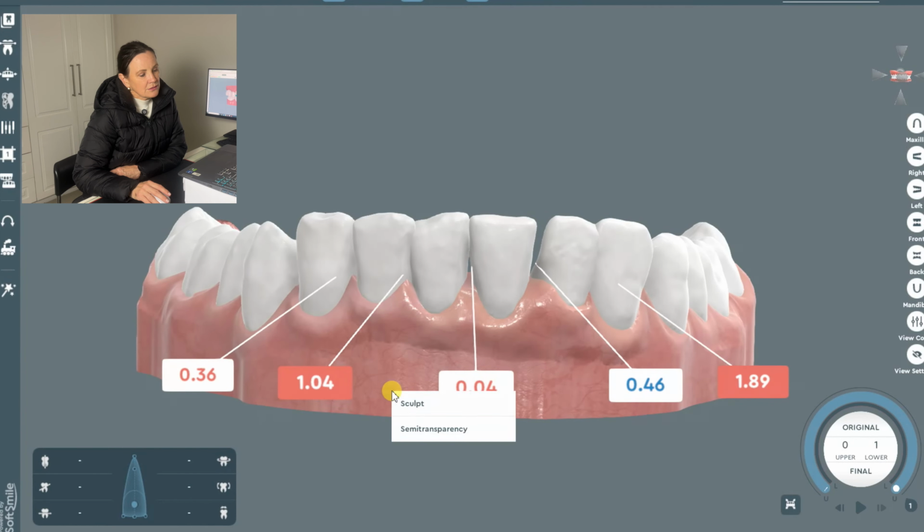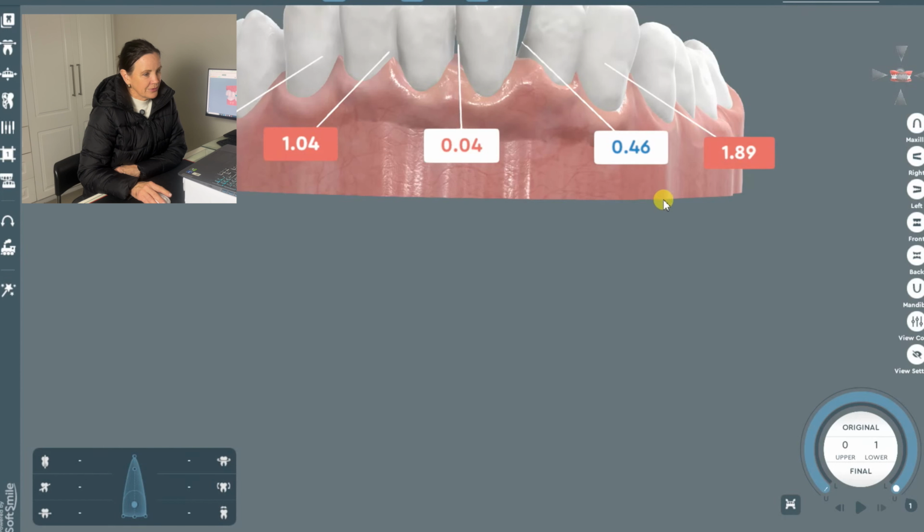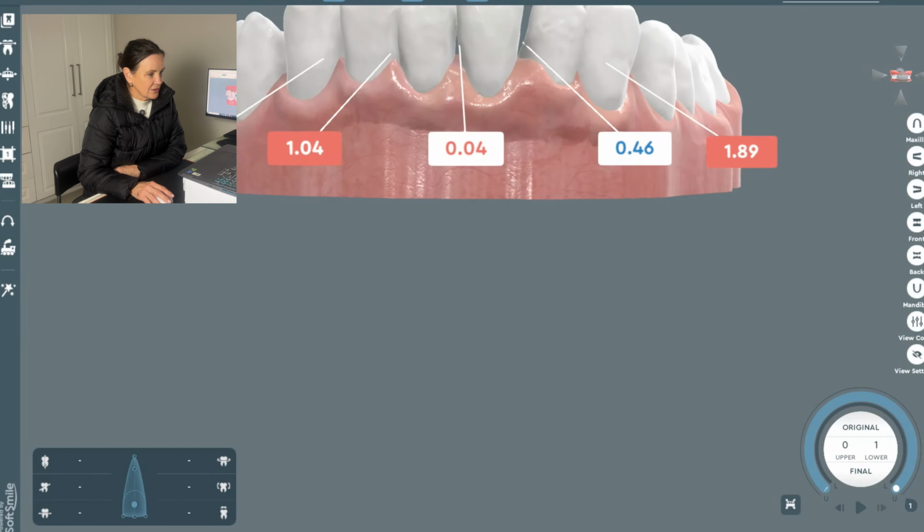When I look at the teeth, sometimes the incisal edges make your eyes fool you in terms of the teeth and the long axis of them. So what I do is I take the model and I move it up and obscure the incisal edges, so as not to have my eyes tricking me. And then I look at the contact points and make sure, because if I do that, I get that dark triangle, and now I can see this tooth is not lining up with that one.